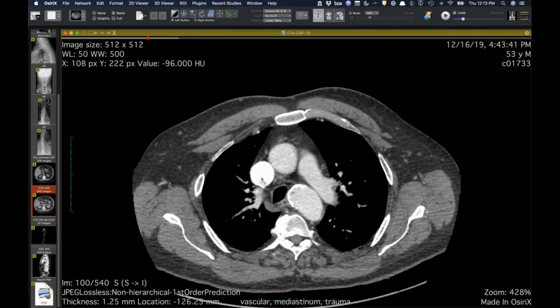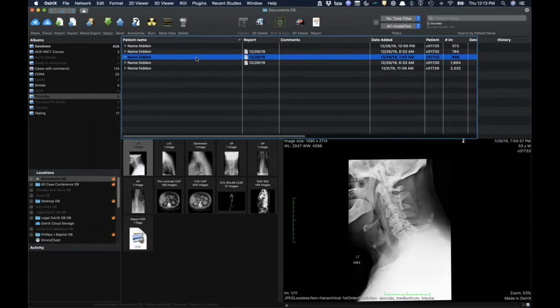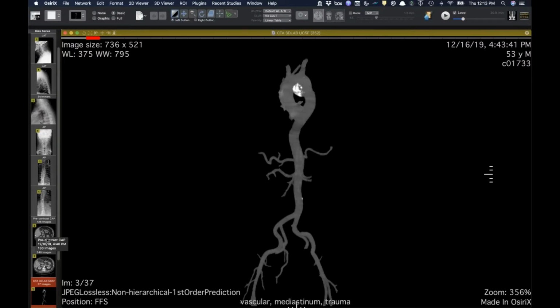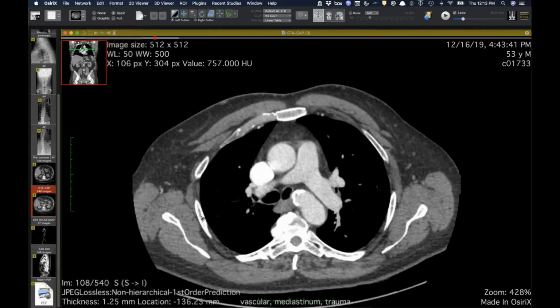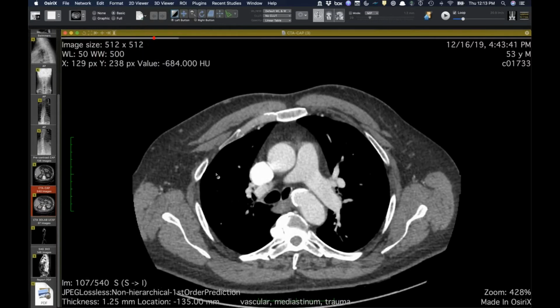Yeah. So that's a nice one. Classic, an aortic pseudoaneurysm. It's interesting that it's medial. It kind of involves that medial aorta. Yeah. You're right. It's a little bit more medial than the ones we typically think about.